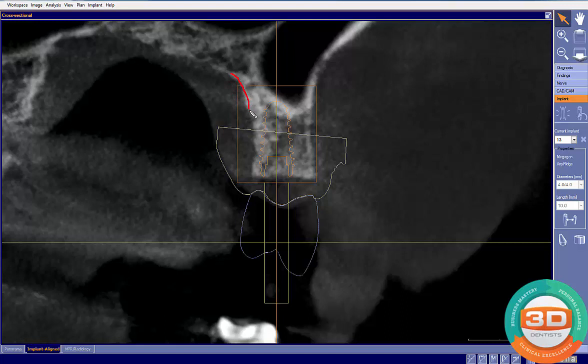this is where I see the bone, just like so. And what I'm concerned about is, let me change colors here. What I'm concerned about is this area right in here. You know how thin it is when we have so much space right here. So what I would prefer to do in this scenario is actually move the implant more centered in the ridge to allow my 1.5 millimeters here, making sure that I keep my 1.5 to 2 millimeters here.